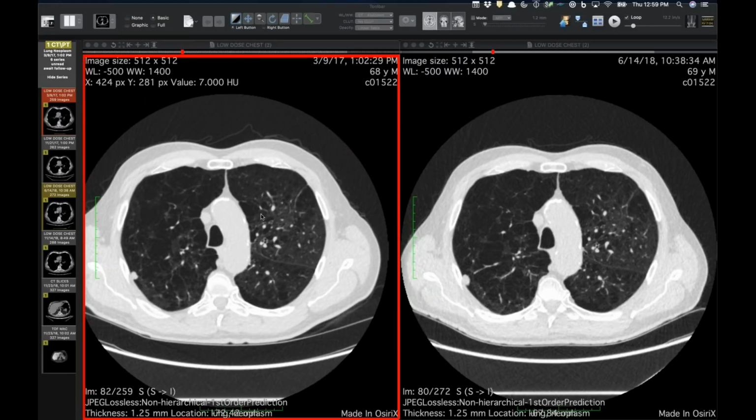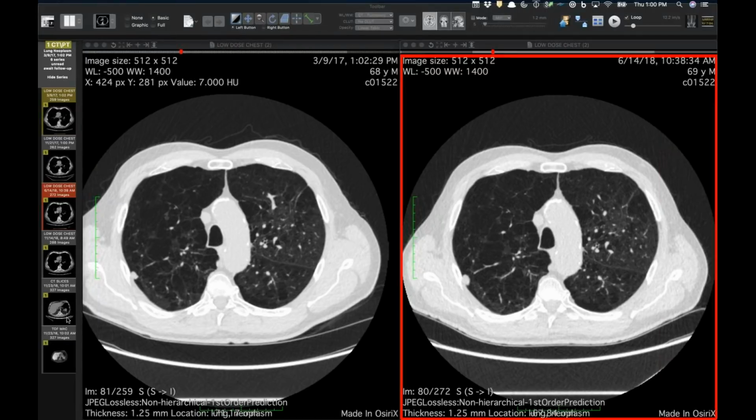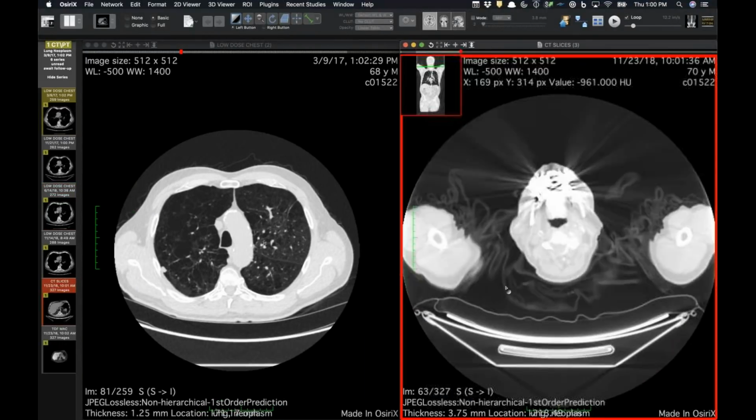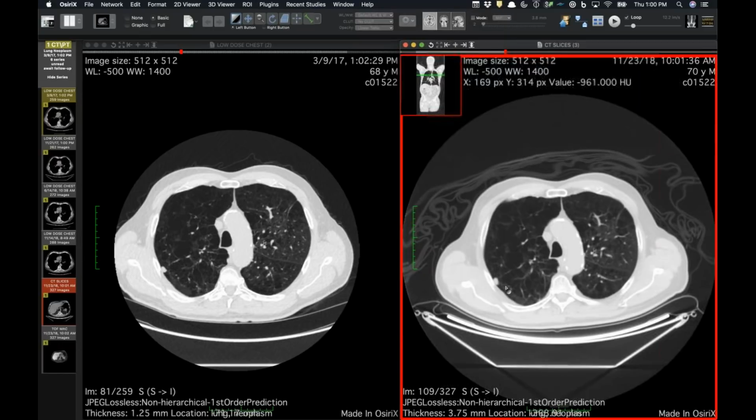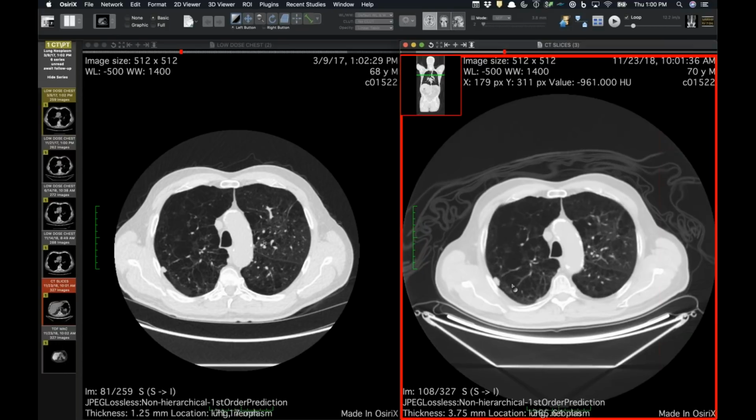Curious. So this is a lung cancer screener from our VA population. You can see he's smoked a little bit at least. This nodule in 2017 was followed every 6 months. It was slowly growing. Then this is June of 2018, and you can see why we're reluctant to biopsy, given his degree of emphysema. So they finally did a PET, and the PET shows that it continues to grow, but there's absolutely no uptake in this thing. Over the course of 17 or 18 months it has more than doubled in volume, but there's no uptake in it.